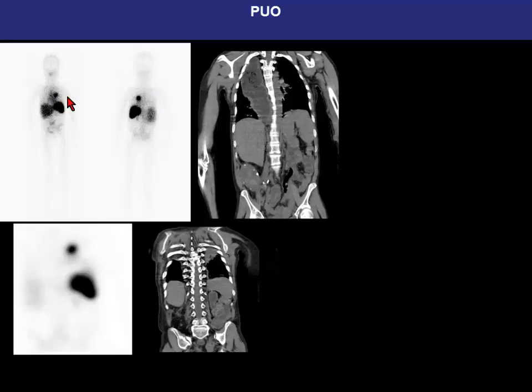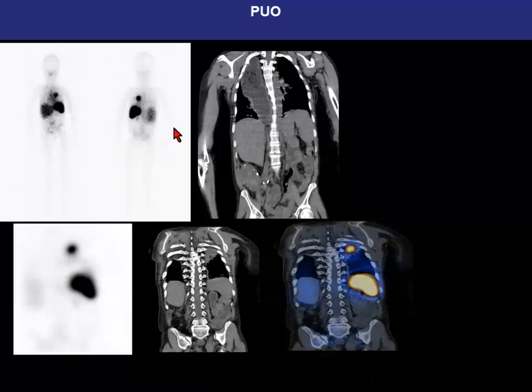The clinical question was where exactly it is, because they were asking whether the patient had any infection to the lung or the renal transplant kidney. The transplant kidney looks relatively fine. So in this case, the increased uptake is in the lung. It was a huge consolidation, and that was the source of infection in this patient.